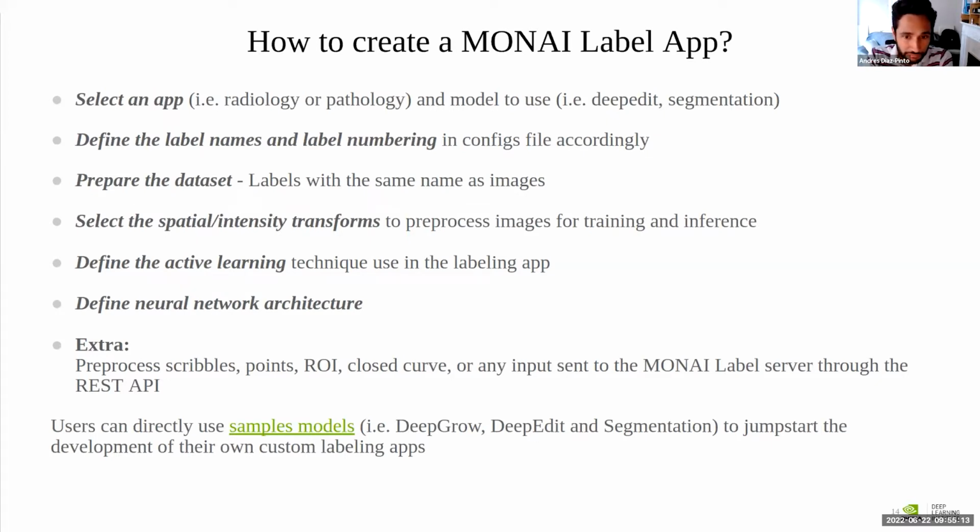For the demo today, we basically skip those two steps. I'm going to show you which label we select and how the data store was organized. So for the demo, thanks to AWS, they organized all these things for us. So we just go directly to the Slicer.